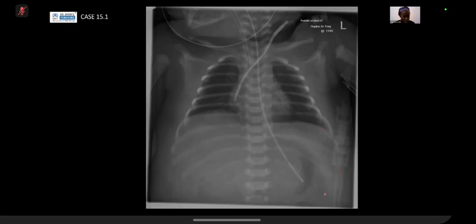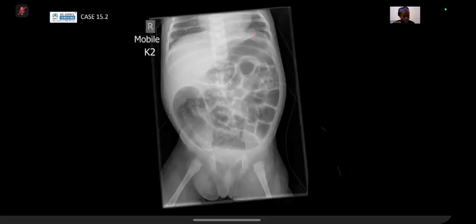So here, if you follow my pointer, this lucency in the abdomen is abnormal. This is the pneumoperitoneum, and it's called a football sign. It looks like a rounded ball of gas sitting at the top, underneath the anterior abdominal wall. So this is your abnormality here. This triangle of gas is your pneumoperitoneum. You can also see that there's no bowel wall around this gas.